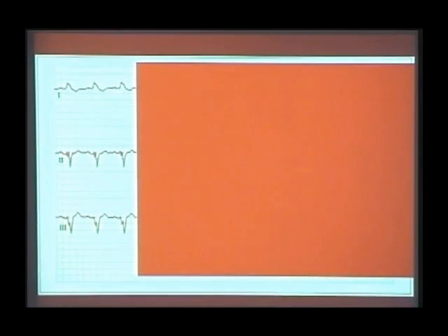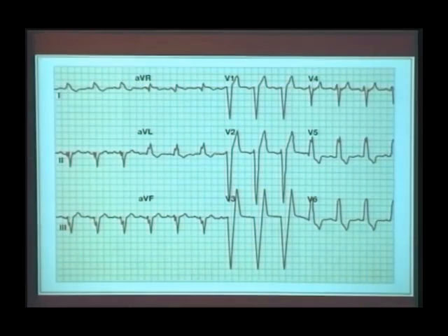As it is being recorded, without looking at the chest leads, if you say it is a bundle branch block of right or left, people will definitely think you are an ECG expert. So you'll have a definite approach to you, whenever they see you, they see you with a lot of admiration.